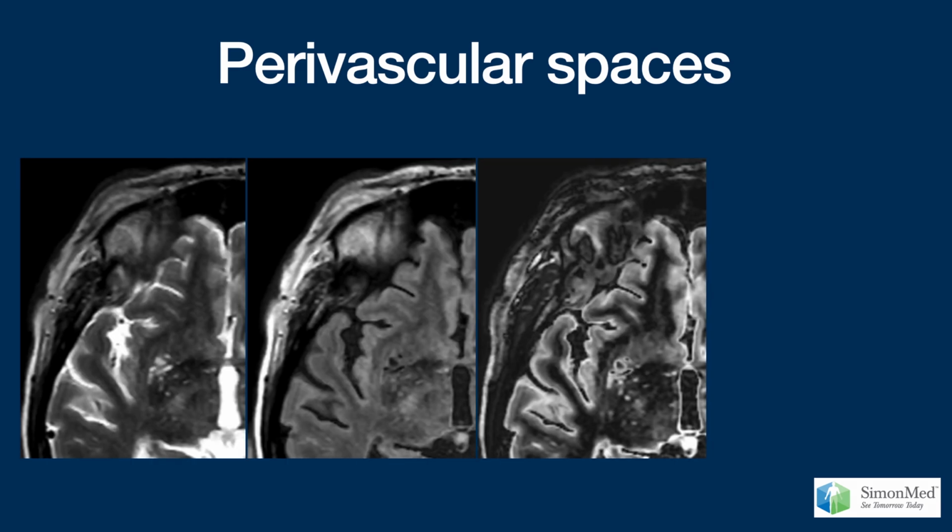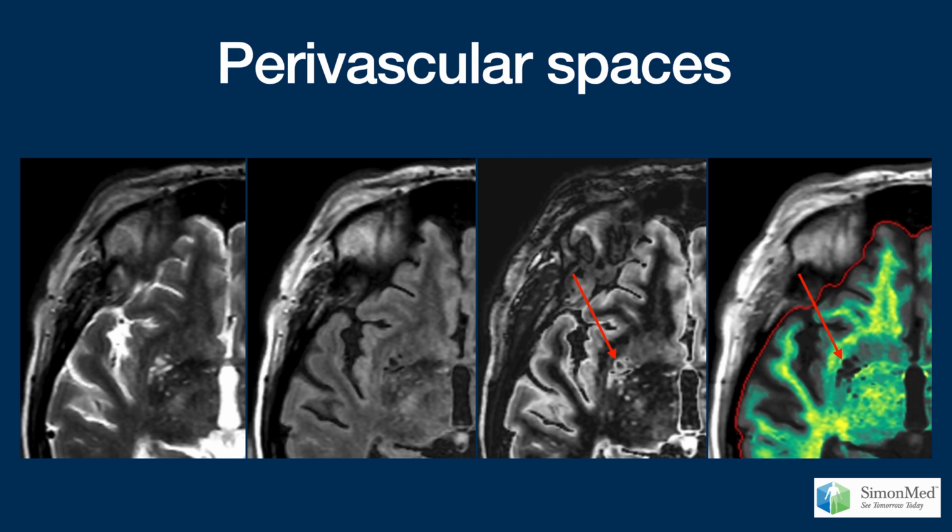These images through the right lentiform nuclei show that one particular large perivascular space has a central black hole and a hyperintense rim on DIR. The myelin image shows that both compartments are devoid of myelin. This is not surprising, given the nature of vessel pulsatility and its potential impact on adjacent tissue integrity. It is enough to make me wonder, though, whether they are simply innocent phenomena.